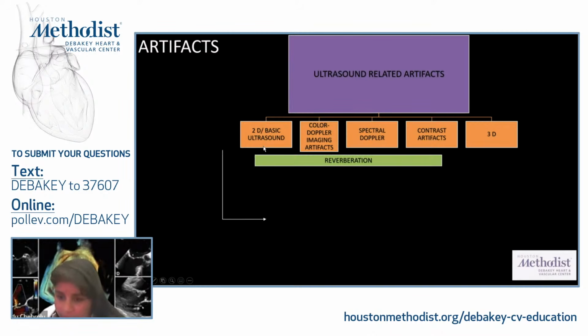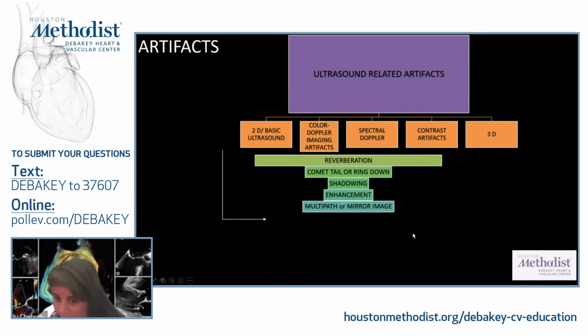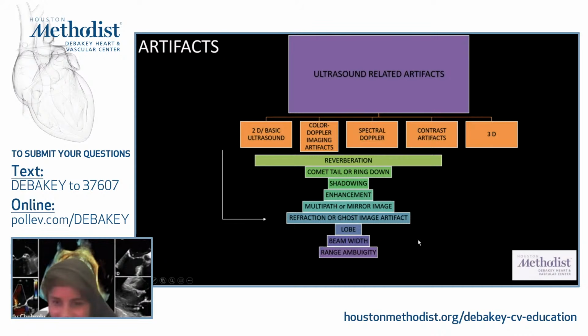What are some of the 2D artifacts which we encounter? Reverberation, comet tail or ring down artifact, acoustic shadowing and enhancement, multipath or mirror image artifact, refraction or ghost image artifact, a side lobe artifact, a beam width artifact, and range ambiguity artifact. I'm sure you're all thinking these are some fancy names which we don't usually use on a daily basis. More than the name, it's the mechanism which we need to understand. It's also important to know the tips on avoiding these artifacts, and that's why I'm trying to elaborate these further.